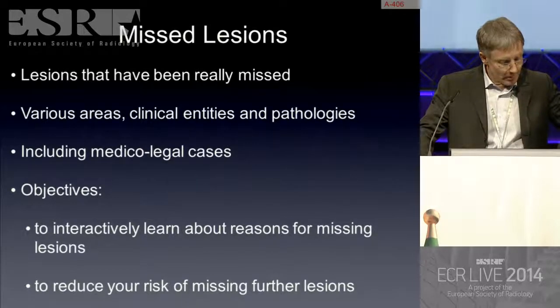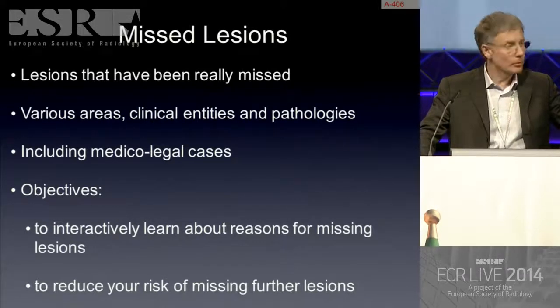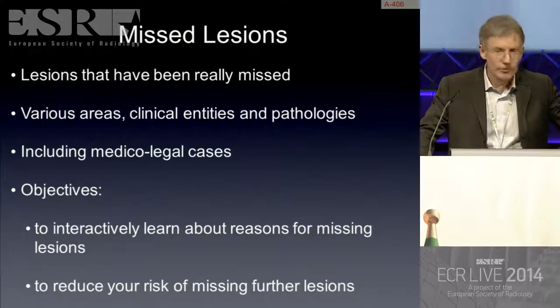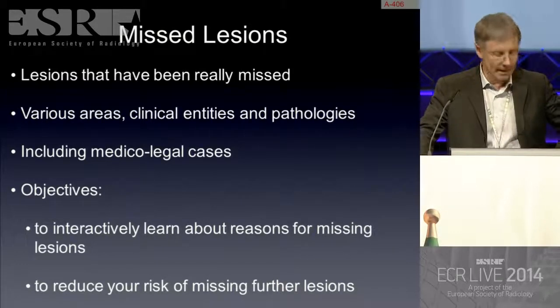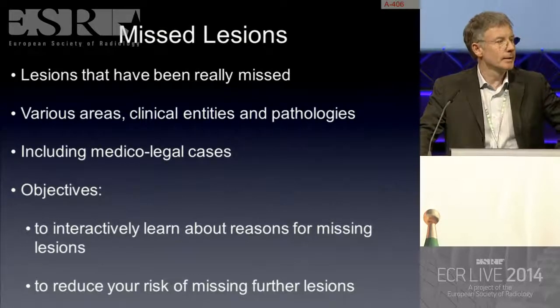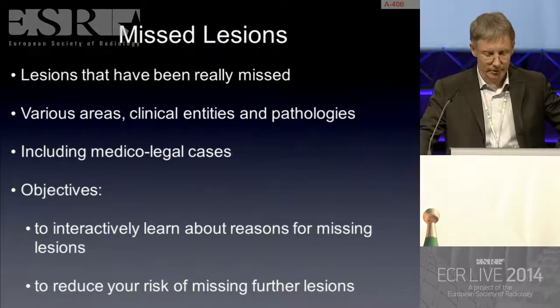And I'll just remind you, of course, that the chest X-ray is very important for the management of patients with chest diseases and is still one of the most frequent causes of malpractice issues. So this afternoon, we will show you 33 cases with 29 questions. And we've tested these cases on keen fourth-year medical students who score an average of 50%. So you can compare your performance with those of these medical students.